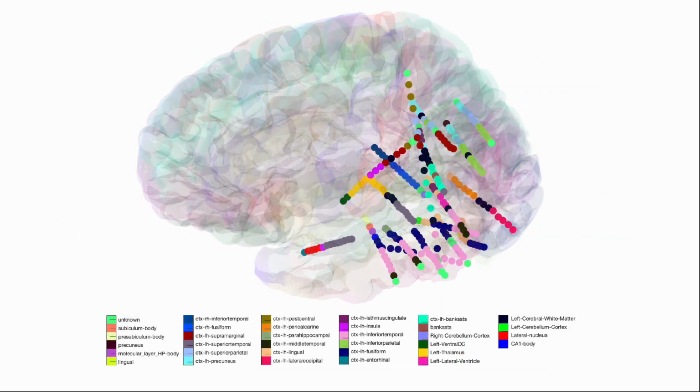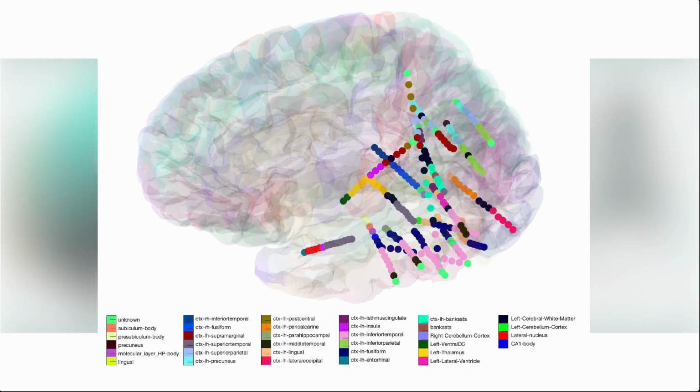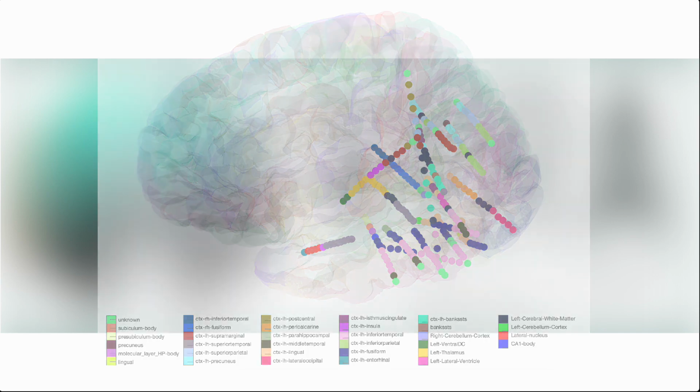The result is a profile of a subject capturing all of the details of the electrode localization in one place, along with the results of each processing step in the localization pipeline, ensuring no information can be lost. A MATLAB data structure packaging the segmented brain model, electrode locations, and labels for many atlases used in the processing pipeline can also be produced for further analysis. In this video, we will talk through the VERA GUI and how VERA assembles different components into pipelines.